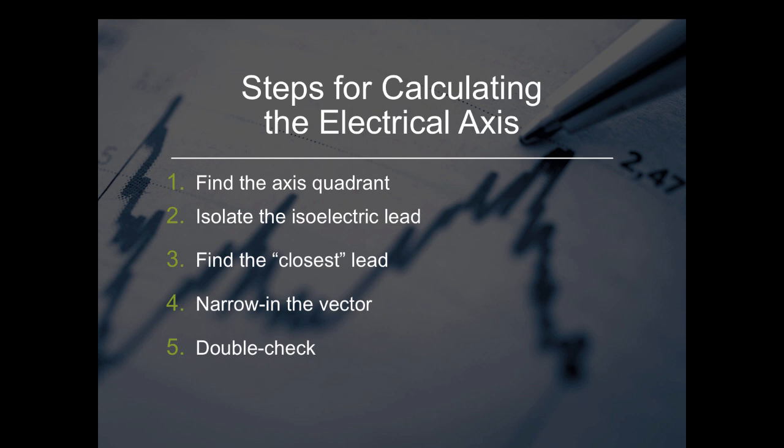We've got that big thick blue line. We drew our arrow at a perpendicular angle. We've got a number. Maybe it's 0 degrees, maybe it's negative 60 degrees, maybe it's positive 120 degrees, but we've got this number. Now we're going to narrow it in a little bit.